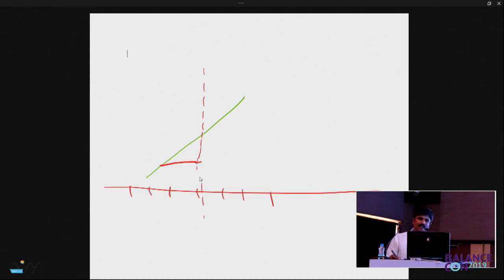The eye is not able to move, is stuck where it is. The target has moved. So where is the target? If you see this line, the target is to the right or left? Target is to the right of the eye.